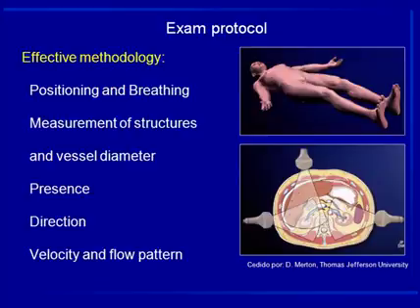You need to study using an effective methodology based on positioning and breathing, measurement of structures and vessel diameter. And you can identify the presence, direction, velocity and flow pattern of the main portal vein, the branches, and the splenic and superior mesenteric vein.